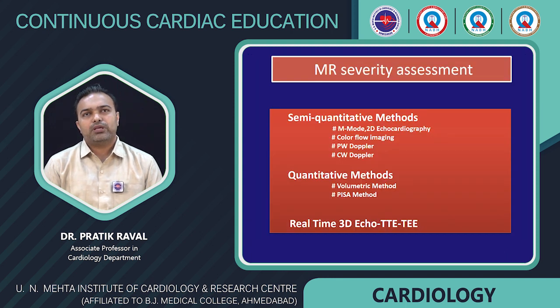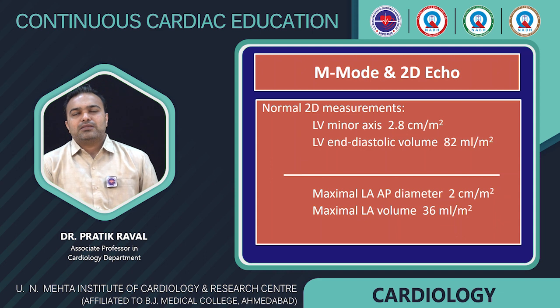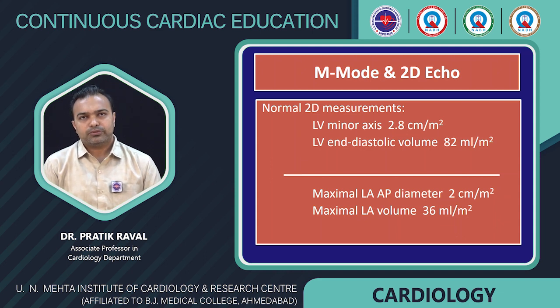So now let us move to the assessment of MR severity, which is a very important part of MR assessment. A comprehensive approach is needed with the help of various semi-quantitative and quantitative parameters to assess the MR severity. The most basic assessment being the assessment of LV diameter and volumes.